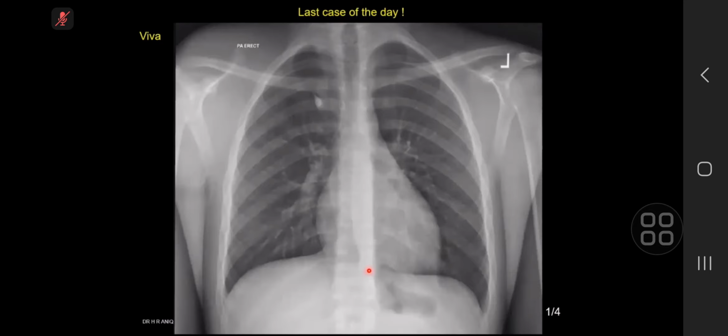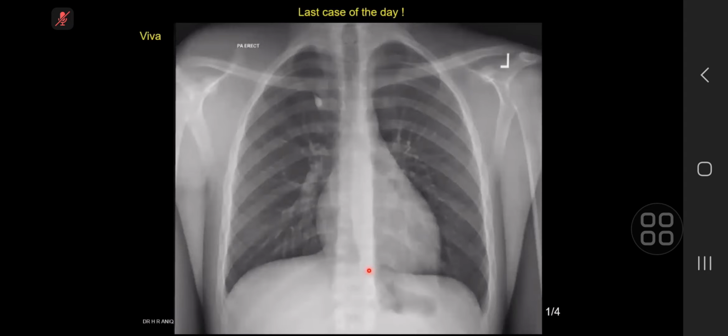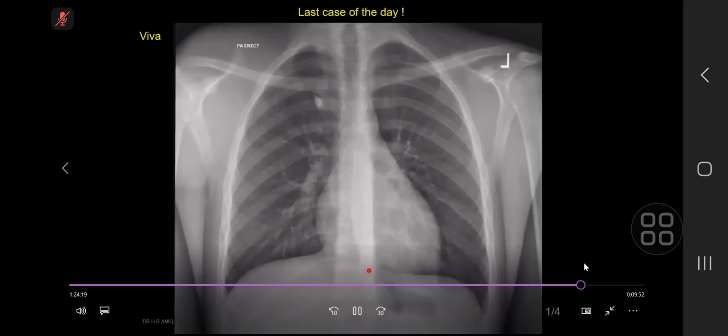And looking at the spine posteriorly, there's a vertebra that appears to be slightly more lucent. Look at the soft tissues, please. On the right, projected over the right clavicle, there's increased soft tissue swelling compared to the contralateral side. So it looks quite expanded. The actual bony clavicle doesn't appear to have any associated erosions. So this may be a soft tissue lesion of the right.